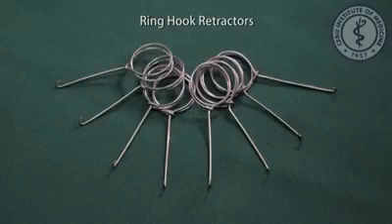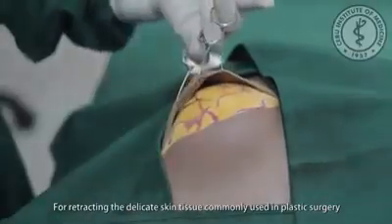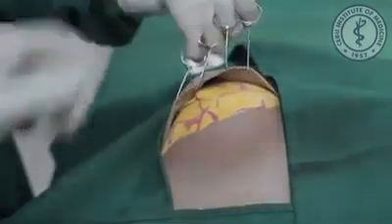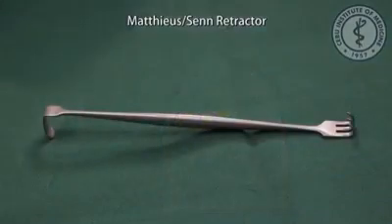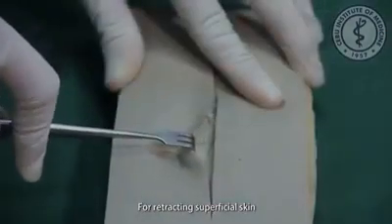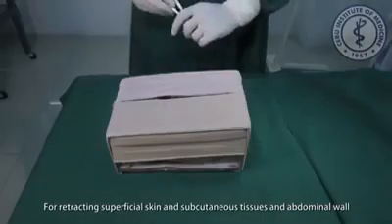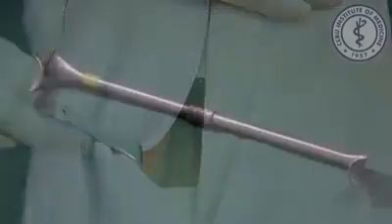Retractors. Ring hook retractors, for retracting delicate skin tissue, commonly used in plastic surgery. Senn retractor, for retracting superficial skin. Army-Navy retractor, for retracting superficial skin and subcutaneous tissues and abdominal wall.